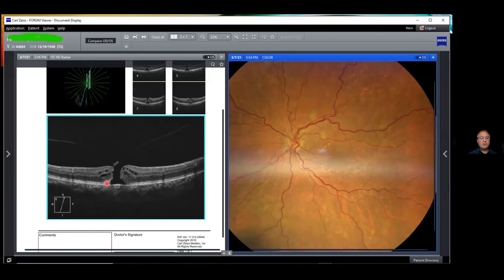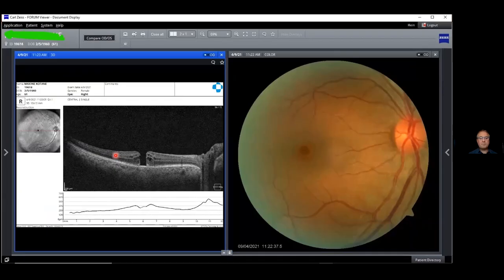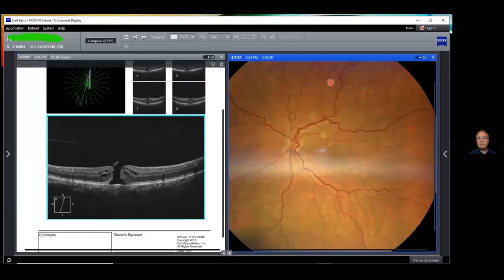So I normally plan to scan these patients every 6 weeks. And if I find that that's going from a stage 2 to stage 3, immediately I go and operate them. This is the patient then that was referred to me on the 9th of April. Again, a lady, she's 61 with a stage 4 macular hole. On the fundus photo, you can see that that fovea is definitely irregular compared to the one that we had before.